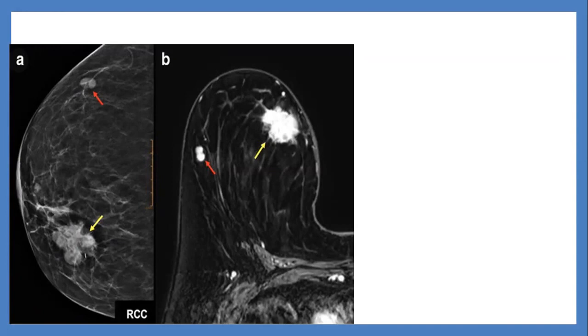Although it looks normal to me, in the MRI I couldn't say, I don't know about the MRI. Okay, on mammography it looks like a normal intramammary lymph node, but with the presence of this mass, I will recommend biopsy or further evaluation of this intramammary lymph node. Okay, because we'll see the mass.